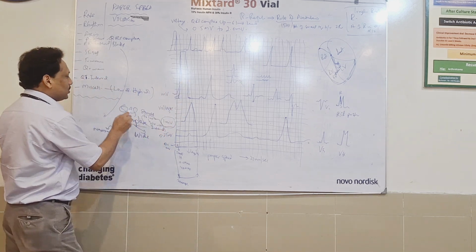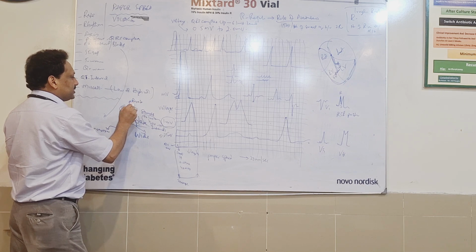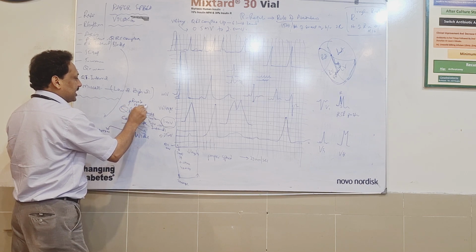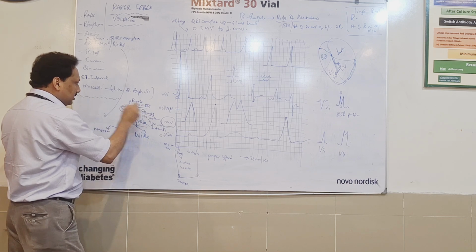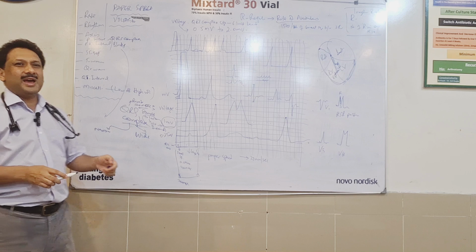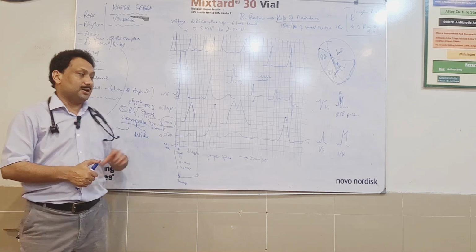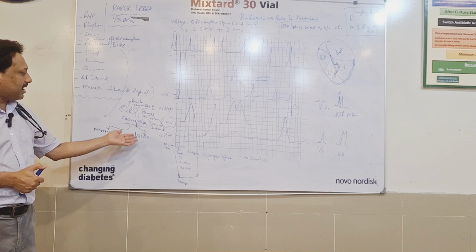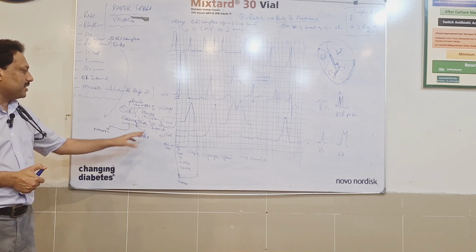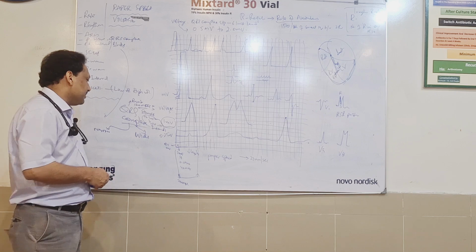So if somebody asks you how to define broad QRS complex, you should say 120 milliseconds or greater is known as broad. The narrow is basically lesser than that. Normal QRS complex size, as I have highlighted, is 80 millisecond to 100, and 100 to 120 is considered intermediate.